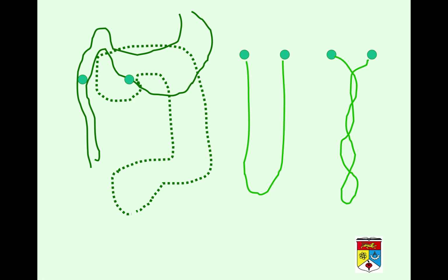However, if there is a malrotation, the mesenteric axis is shortened. For example, in this case, you see the distance between the DJ flexure and the ileocecal valve is very shortened. It's not smiling broadly now, so it's prone to get twisted because it is shortened.